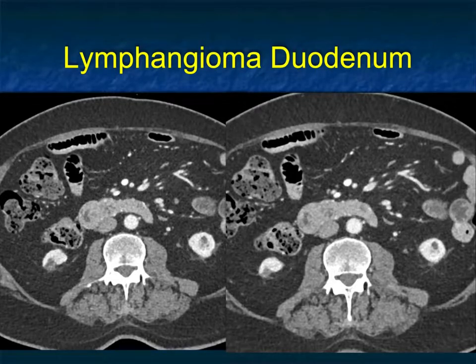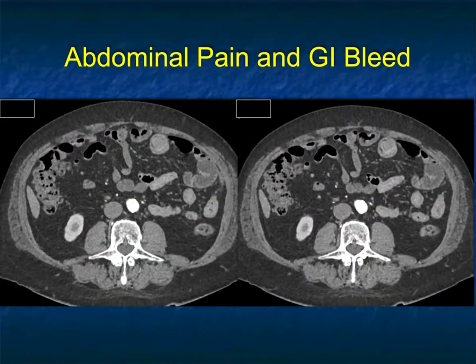So not every tumor that bleeds is malignant. This is a very unusual tumor. That was not my first choice, but it's something to think about.